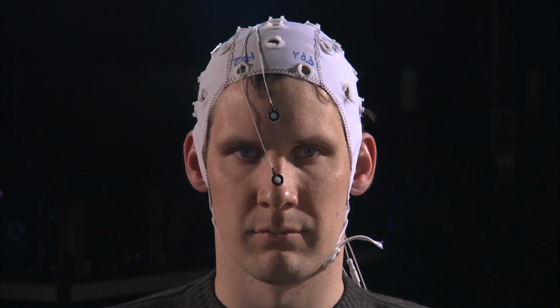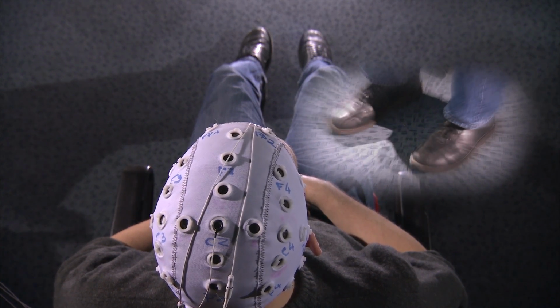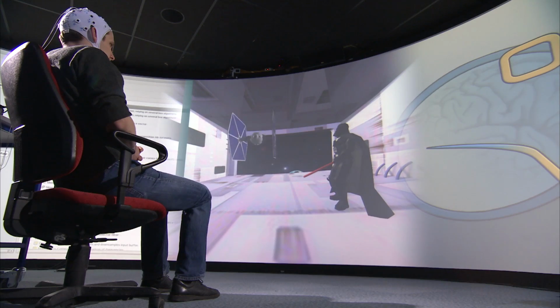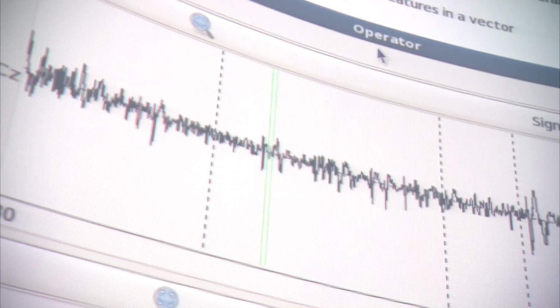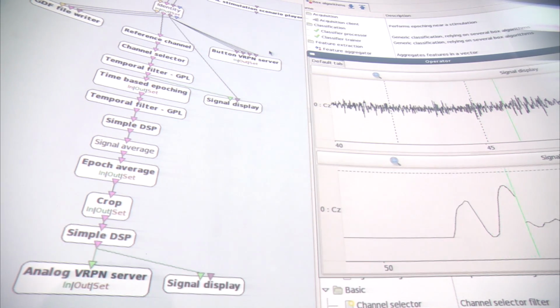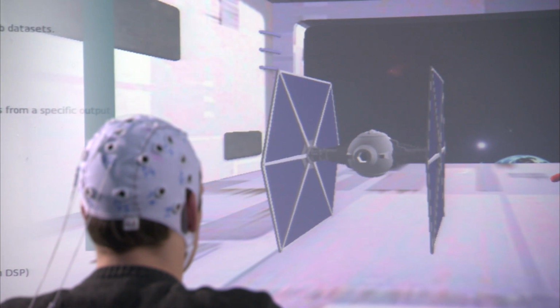After a concentration phase, the user must now only imagine that he is moving his feet. When the thought of movement stops, the signal from the EEG is the same as the one observed when real foot movement stops. The software can then send the command "Raise the spaceship" again. Since it consists of a single command, this is a one-class brain-computer interface and is in asynchronous mode since the user can raise a spaceship at will.